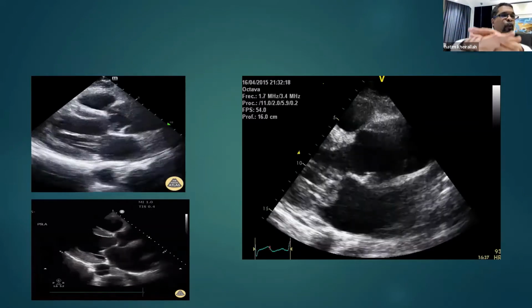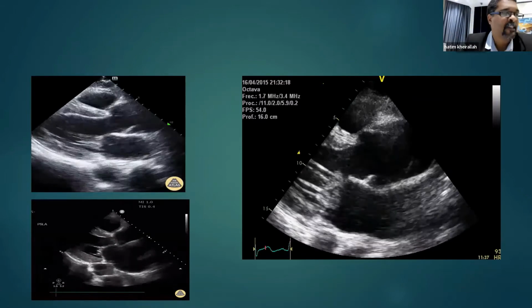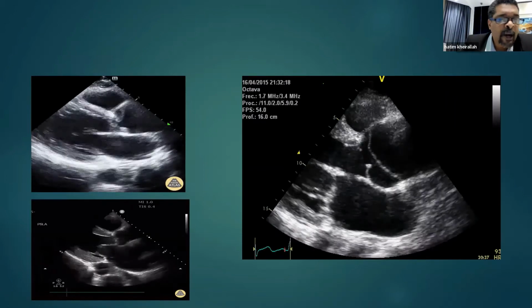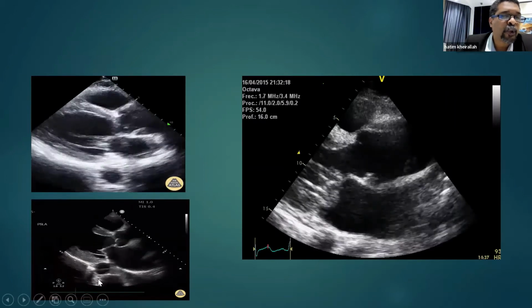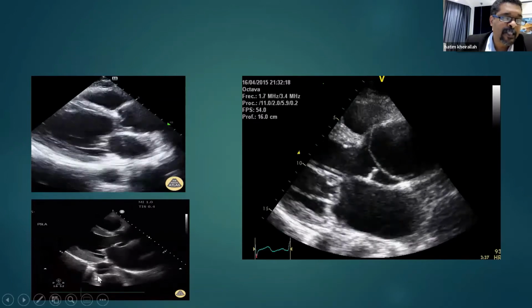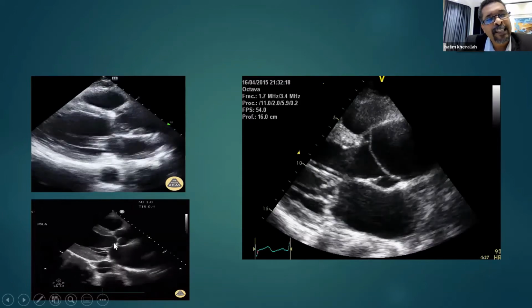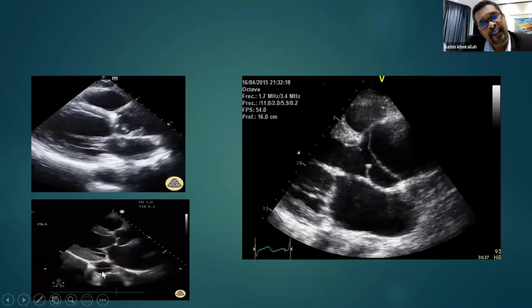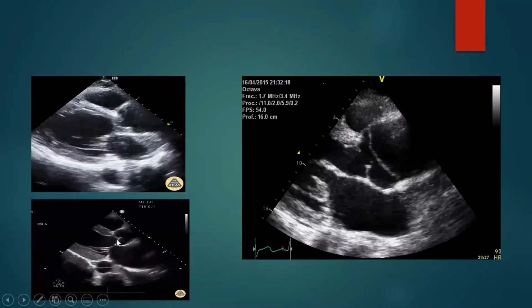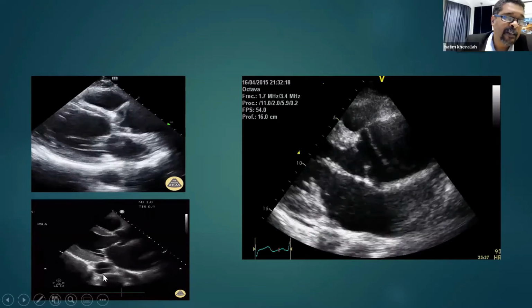We tend to be blinded or confused about seeing anything else, and this is satisficing. One of the problems is that we don't usually focus on this black hole down here, which is the descending thoracic aorta. So if you don't see a dissection flap there, you might see it here. Or sometimes you can see a dissection flap that goes all the way up and down here.